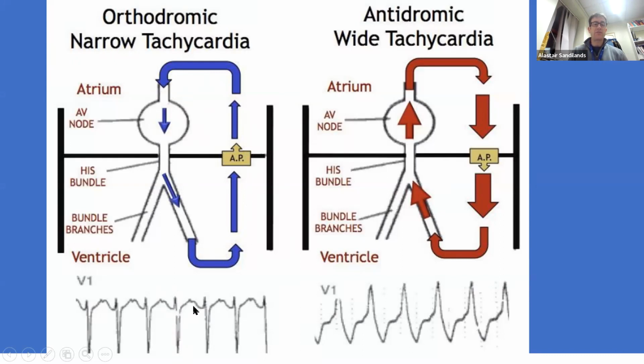Okay, and in this example, you can see some activation of the atrium. There is a little bump here in the T that would signify the P wave, or the backwards activation of the atrium by the tachycardia, just in this example. But it's a regular narrow complex tachycardia.